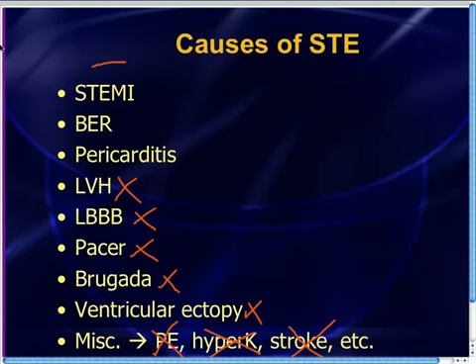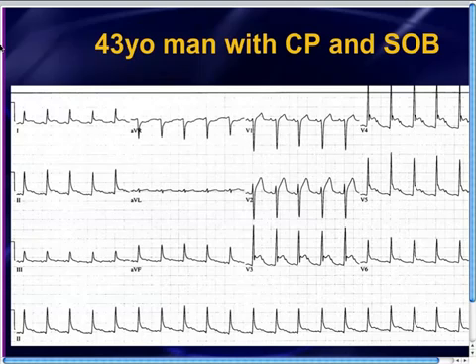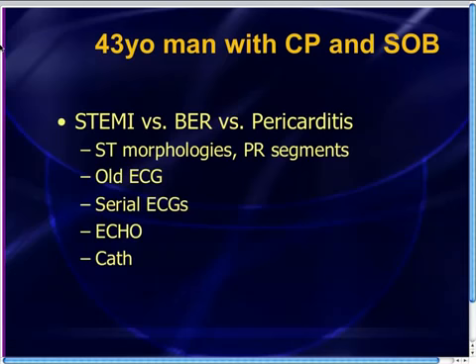So essentially what we've got is a very common quandary. Is this ST elevation MI, is this benign early repolarization, or is this pericarditis? All right, so when you're trying to figure those things out, there's some simple techniques that you can do.